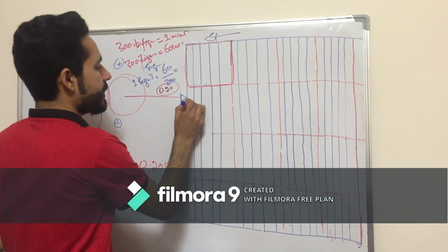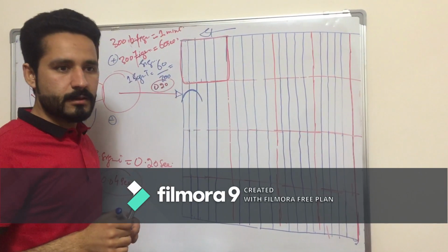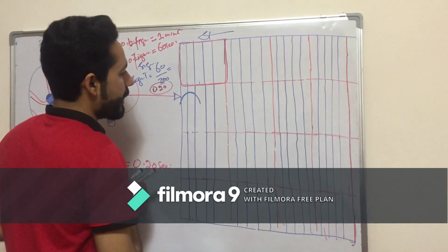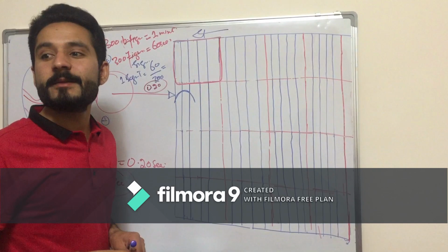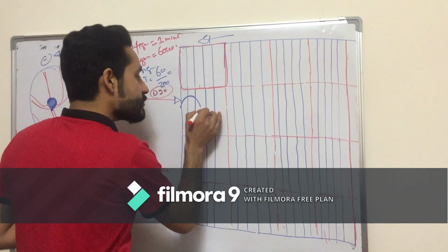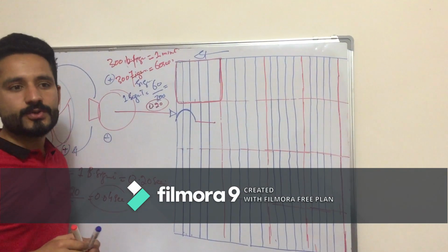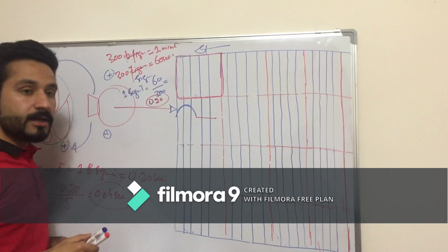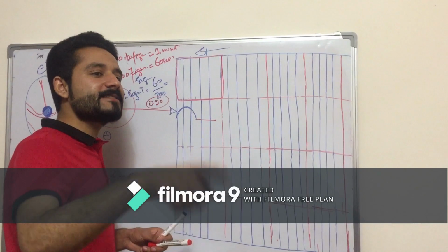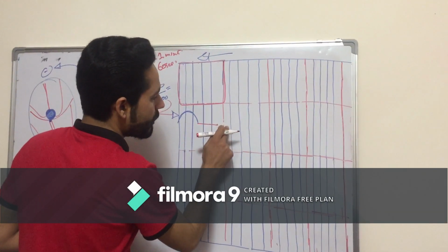The next, the PR segment or the PR isoelectric line, will also occupy the same 2.5 segments. And next, the QRS complex will also occupy the same 2.5 segments.